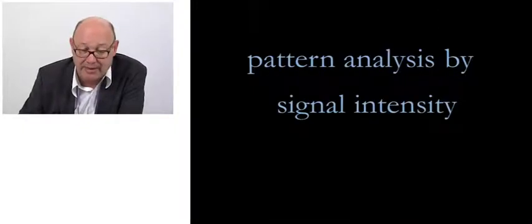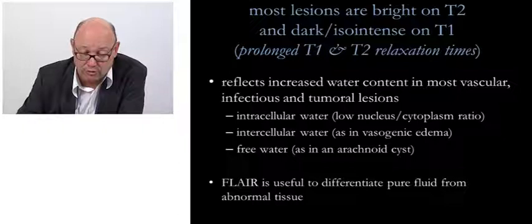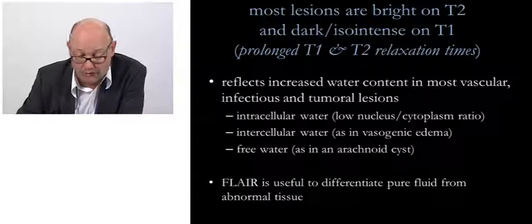Let's take a look now at pattern analysis by signal intensity. You know that most lesions are bright on T2 and they are dark or iso-intense on T1 weighted images. Well, this is rather aspecific.